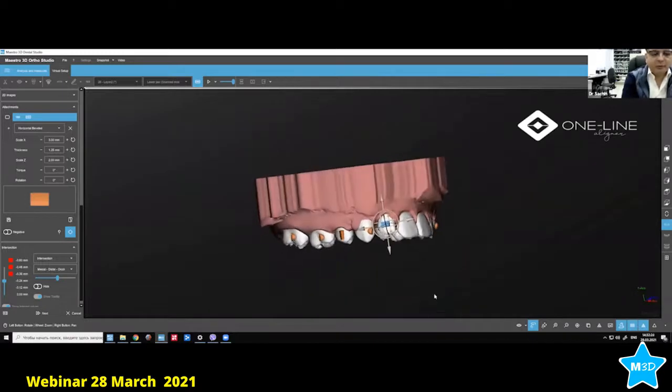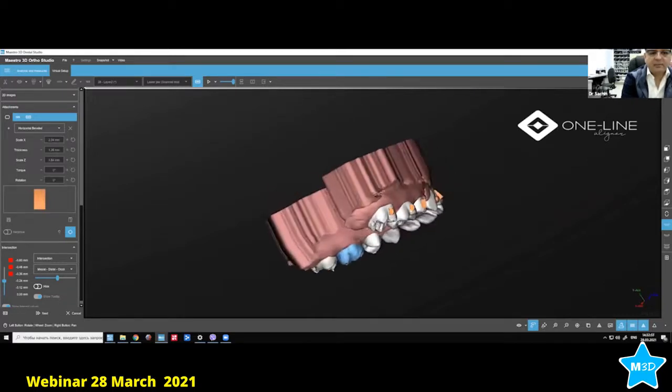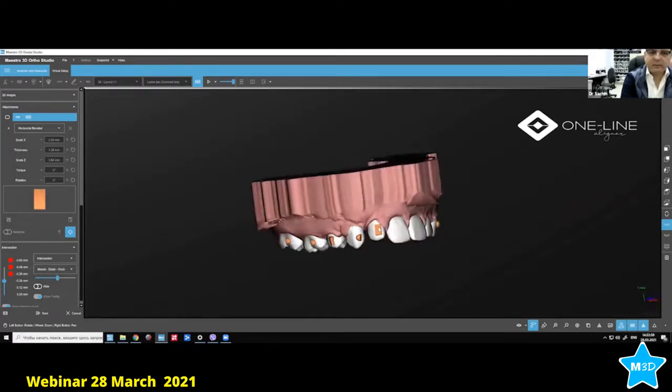If you put it like this in the center, you're going the wrong way, because you want a mesial rotation. What happens is that there is pressure on the distal side as well, so the rotation will not happen completely. You need to make sure that your extrusion attachment is mesial and of good size. Do you see the shape now? Okay, this is one kind.